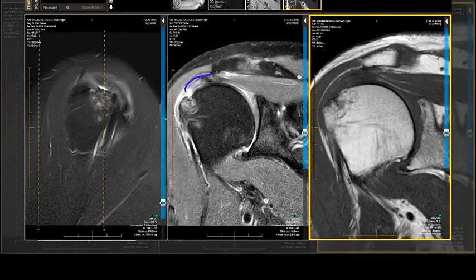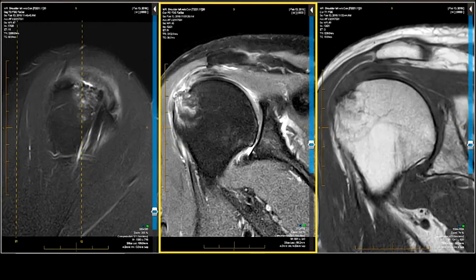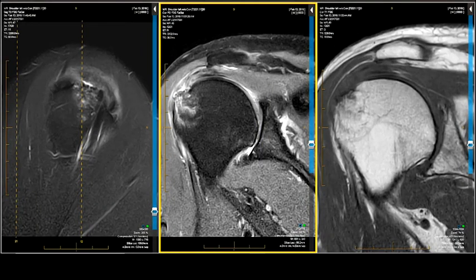Or when you're 20, you pick your arm up, the bones are normal, and this bumps into that because you have muscular imbalance. And when you're 70, it's almost always anatomic because you don't do enough vigorously to really generate microinstability. So there's more. The humeral head is slightly elevated. If we take this step off, it should be right down here. So the scapulohumeral line should line up with the inferior glenoid. There's humeral head elevation. There's some loss of the depressor mechanism. There's some glenoid deformity with glenoid slope. Right? The glenoid should be up and down like this. It's not. So while the conformity was normal in the axial projection, it's slightly altered in the coronal projection.